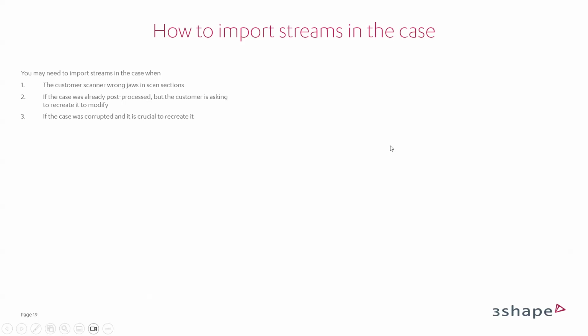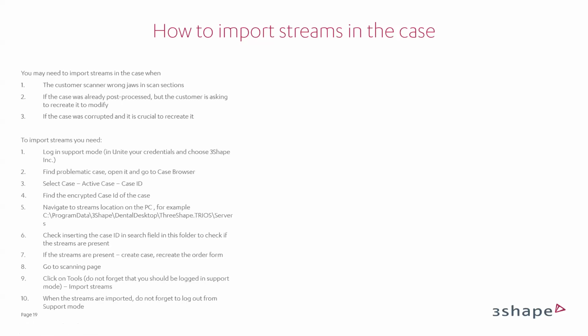Also, here's a short guide on how to import the streams in the case. You may need to import the streams when the customer scanned the wrong jaws in the scan selection. The second option is if the case was already post-processed, but the customer is asking to recreate or modify the case. Or if the case was corrupted, and it's crucial to recreate it.